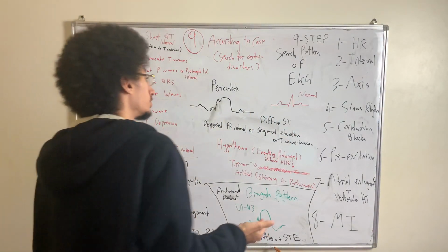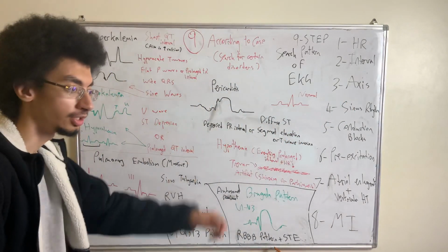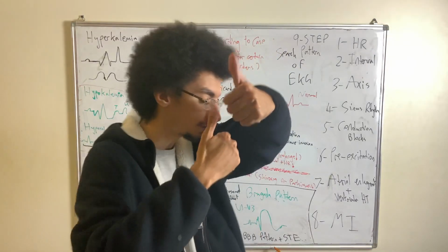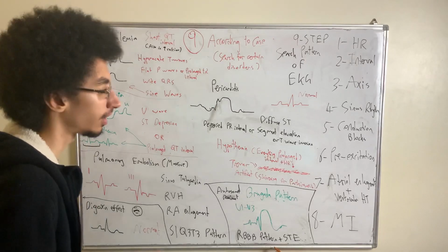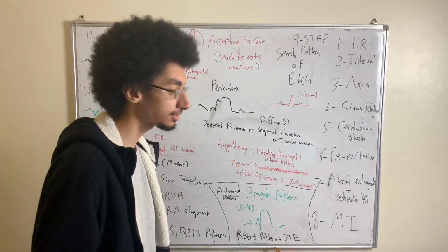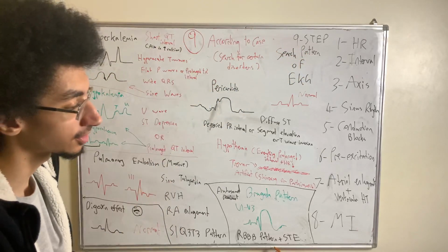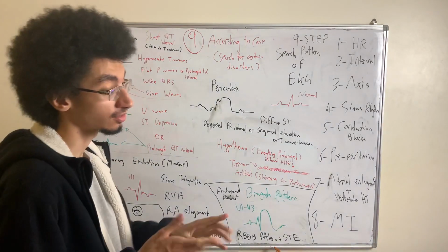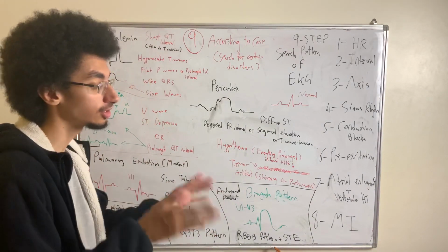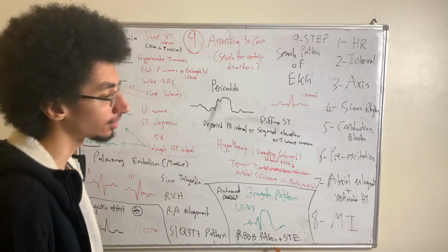And then afterwards, you check for the axis of the P wave, T wave, and the QRS between lead 1 and AVF. And then next, you check for the sinus rhythm. You ask yourself 5 questions. One of them you already asked by that point: you ask yourself about the heart rate. You ask whether there's a P wave and what it looks like. What about the QRS? Is it wide or narrow? What is the relationship between the two? And whether the rhythm is regular or irregular.